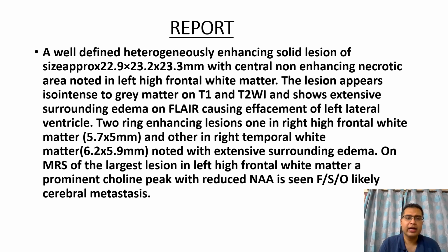And this is the report that I had given: a well-defined heterogeneously enhancing solid lesion with central non-enhancing necrotic area, which was seen in the left high frontal white matter. The lesion appeared iso-intense to gray matter on T1 and T2 and showed extensive surrounding edema. So this is very important. The lesion showed disproportionately extensive edema in the surrounding white matter, which was causing effacement of the left lateral ventricle.